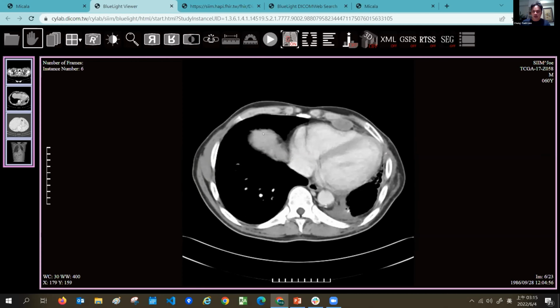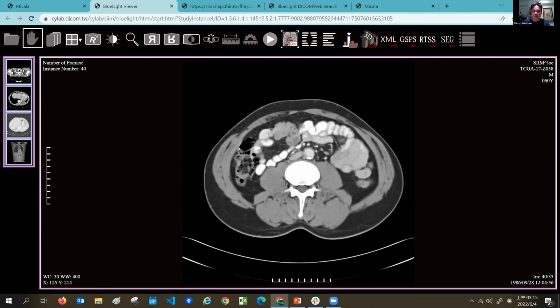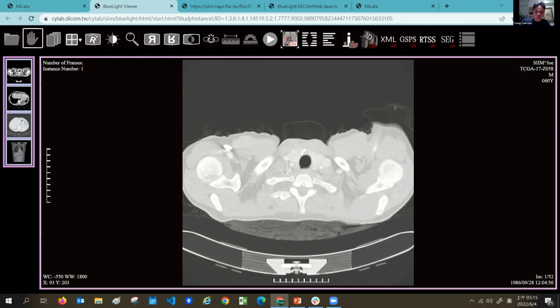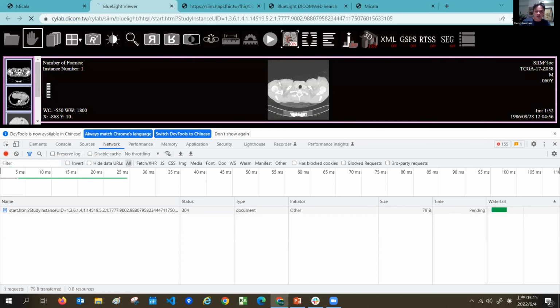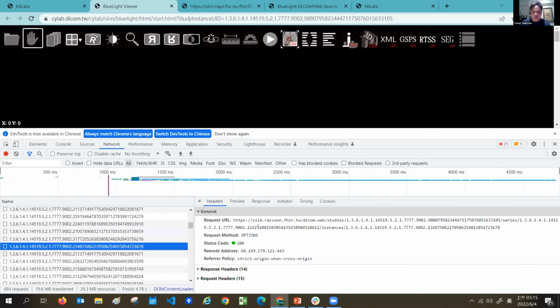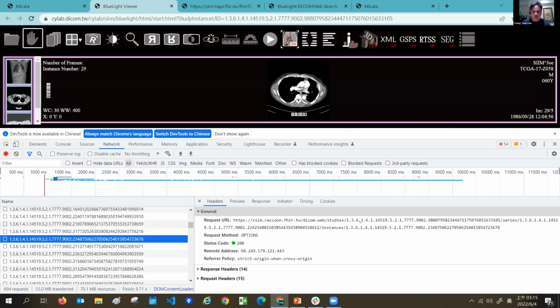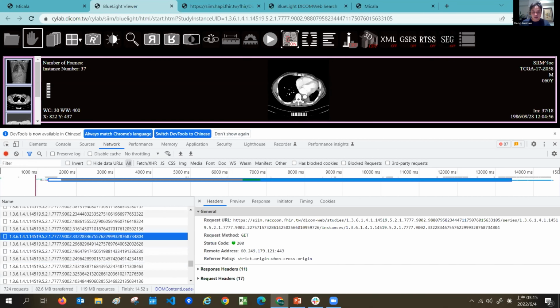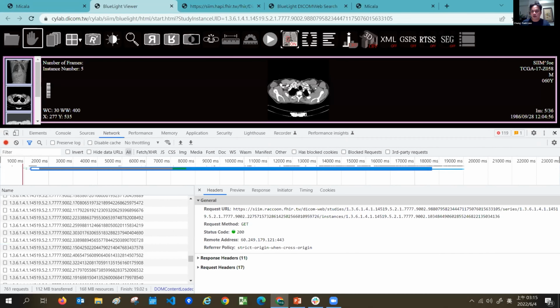It needs some time because we are in Taiwan, so there is a little bit of traffic. So let me just wait for screenshots. Oh, maybe we'll try again. So we can see there will be a lot of DICOM communication here. So that's here. Okay. So here. So click it. Oops.